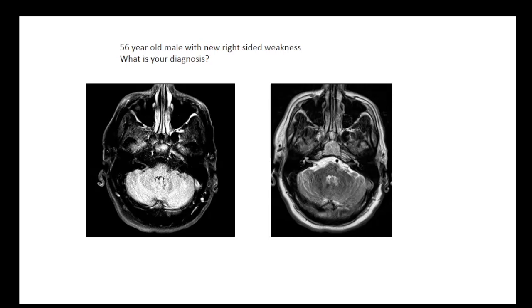All right, so we're divided here in opinion, and the correct answer here is a left carotid abnormality. Now I wanted to show you this case because, again, like many things in radiology, the most important thing is just to have seen it. So most of you have probably not seen cases like this, but this is the internal auditory canal. Here you have the inner ear structures. You really shouldn't have any signal over here in the petrous apex. That's not because there's nothing there. It's because you have bone. Sometimes you have air. And in all patients, somewhere in here is the petrous portion of the internal carotid artery.